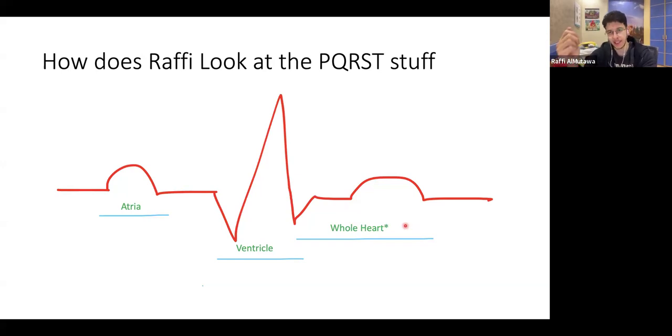So for example, ST segment MI or ST depression or non-ST, you're looking at the ST segment, or diseases like pericarditis where you have all of the ST segments elevated and PR depressed, but don't worry about that for now. But that's the thing. You can literally look at these 3 parts and understand what's going on. So that's why in the systematic analysis, you do want to include looking at the P, QRS, and ST.